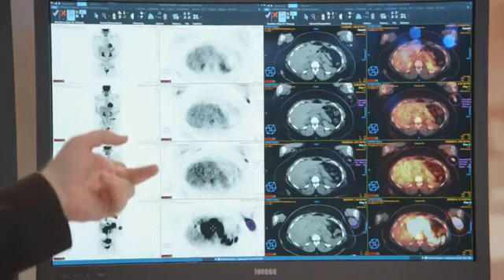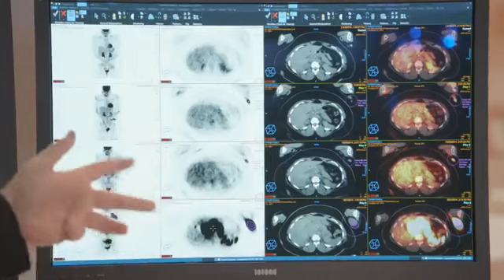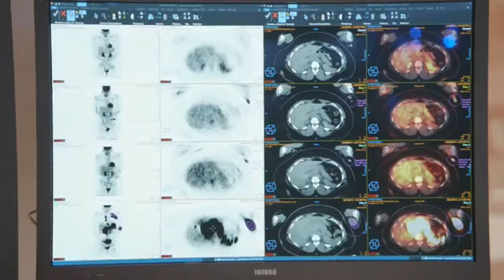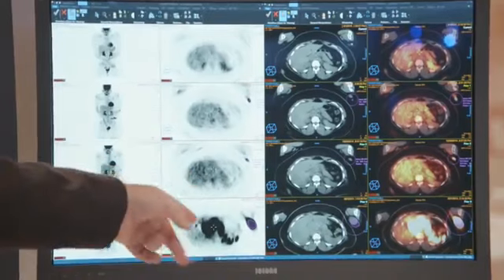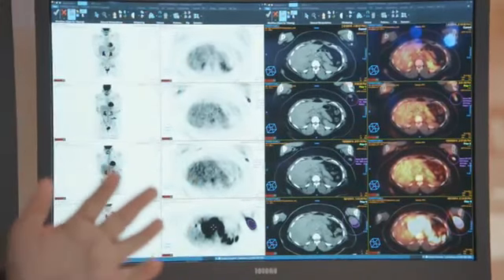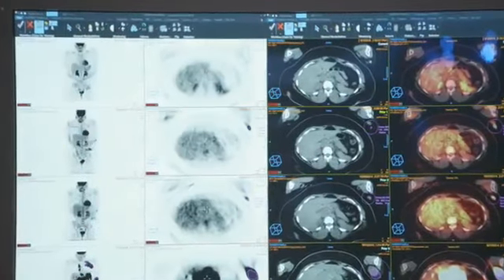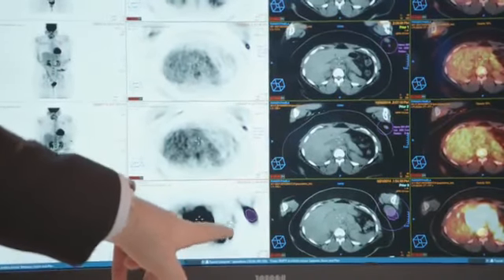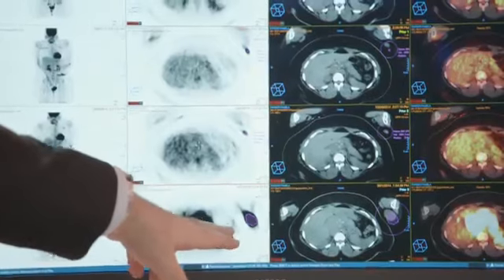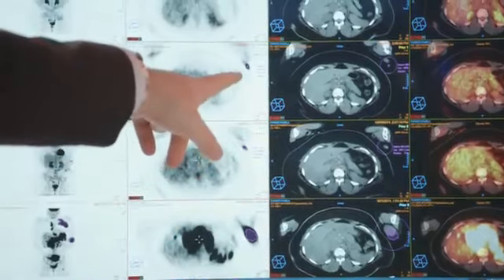So this study uses a technique which actually measures inside the PET study and gives us SUV values. SUV values are standardized uptake values of the PET, and it will quantify the lesion over the PET. So if we can do the same quantification over each of the PETs, we can see a trend of the progression of the disease. This is exactly what we did here. The radiologist already marked a segmentation over the oldest prior, and he did it once again over prior 2 here, and once again over prior 1.